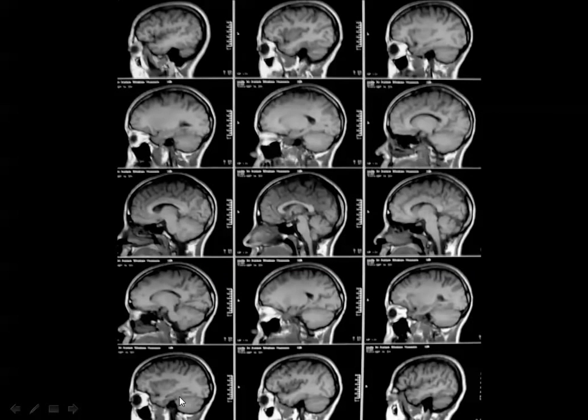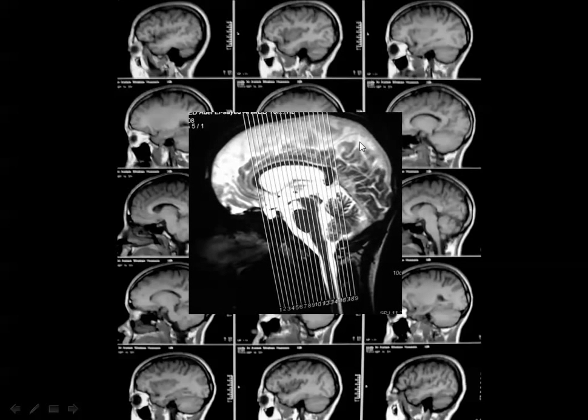Then these are the sagittal images, and you all know that we start in the sagittal images from the left and proceed to the midline, then we reach the right side of the patient. Then if you are asked about this lobe, this is the left frontal lobe, and this is the left temporal lobe, and this is the left cerebellar hemisphere, and this is the left parietal lobe, and so on. But in the midline image, you should not see any brain tissue. You should see only CSF, like this sagittal T2 weighted image, and you can see CSF in the midline. This can be seen if you are cutting exactly in the interhemispheric fissure.